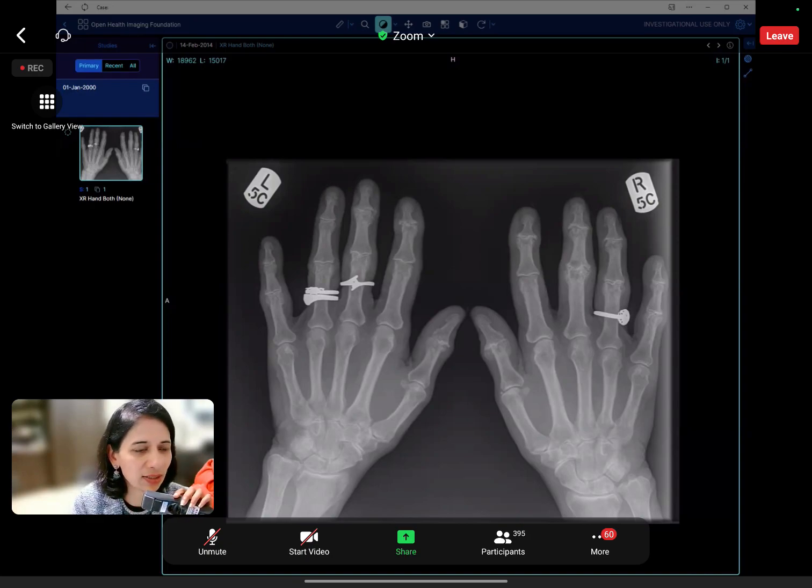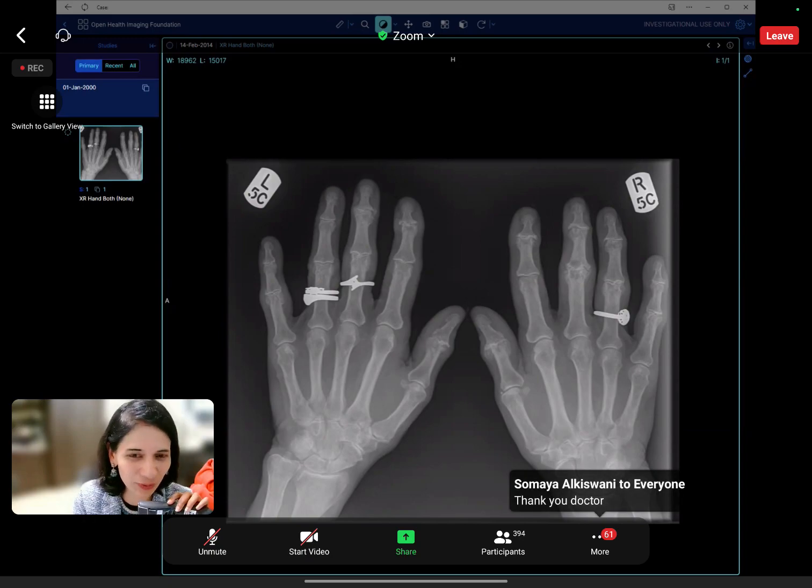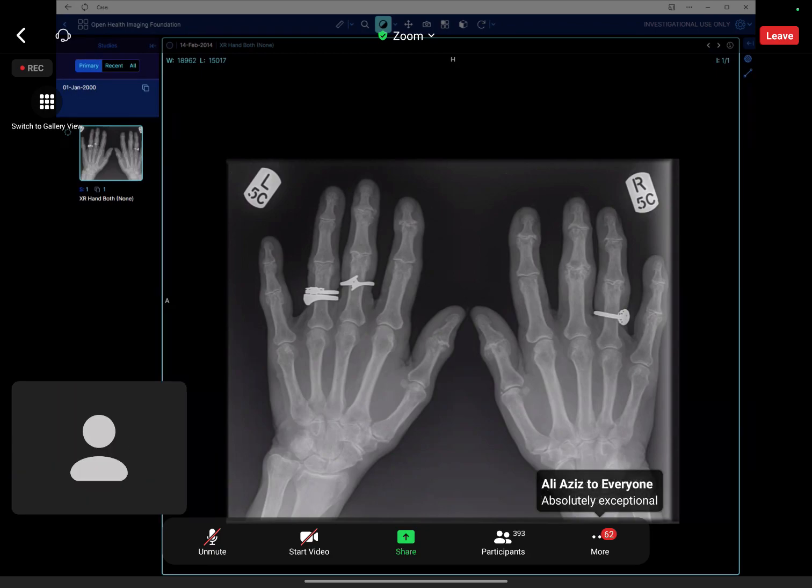Just do the description, and all of you keep forgetting to ask for the other view. Please ask for the other view. In your case, it didn't contribute much, but we want to see what your practice is. So please don't report on one view. Yeah. Got it. Okay. Thank you.